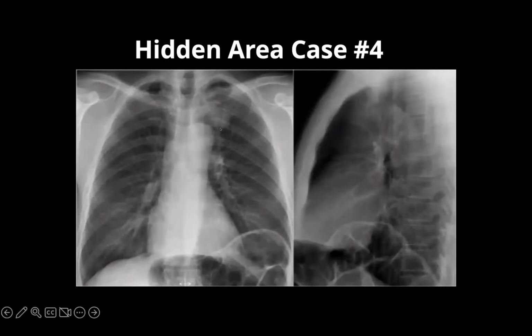Now, we would add this one as maybe a plus or fifth hidden area to our 4 areas, which has this particular area corresponding to the costochondral junction of the first rib. We usually mistake that for masses in an elderly where there is degeneration, and that is not the scenario in this case, because this is very unilateral and this is a very well-defined opacity.